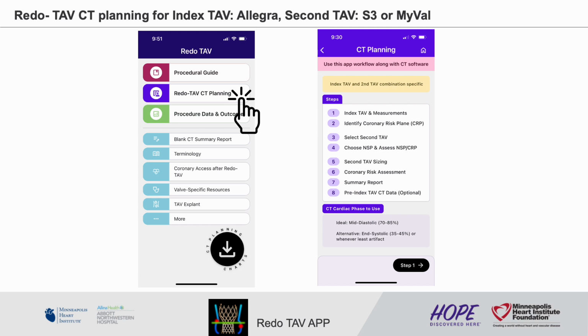you need to do. The CT acquisition protocol can be the same as the routine pre-TAV assessment. It's recommended to obtain an ECG-gated multiphasic CT that covers the entire cardiac cycle, ideally with 20 phases, a minimum of 10 phases. The mid-diastolic phase generally has fewer artifacts, allowing for better assessment of the prosthesis's leaflet and commissure alignment in most patients. The end-systolic or end-diastolic phases could be used as alternatives.